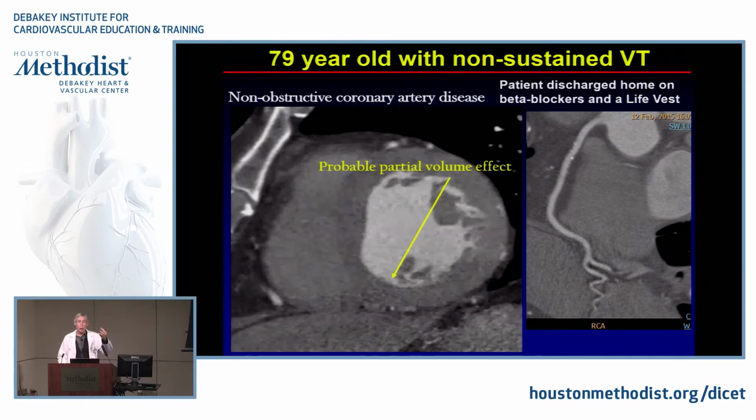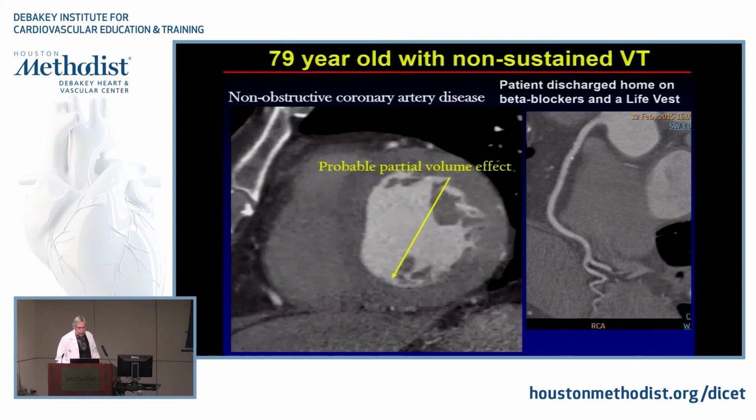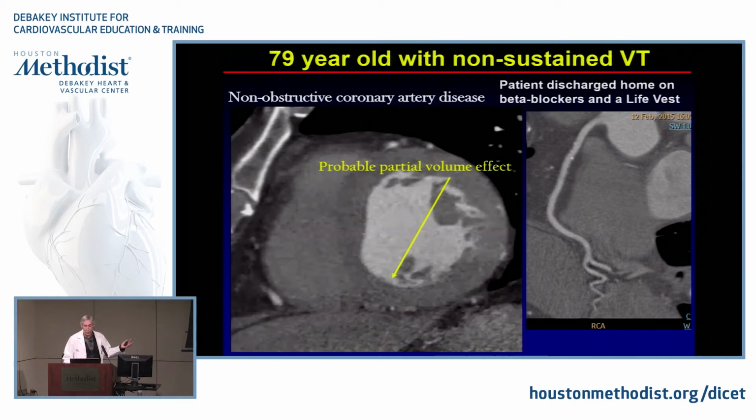or the patient had non-ischemic cardiomyopathy plus coronary disease. That also happens. But based on what we saw from the rest of the scintigraphic results, it doesn't look as though the ejection fraction reduction could have been due to extensive coronary disease, because the defect was very small. So based on that, we tried to get clarity, and clarity was done by doing a CT. I just want to emphasize that CT is actually a very good way to get at this problem and clarify the images.